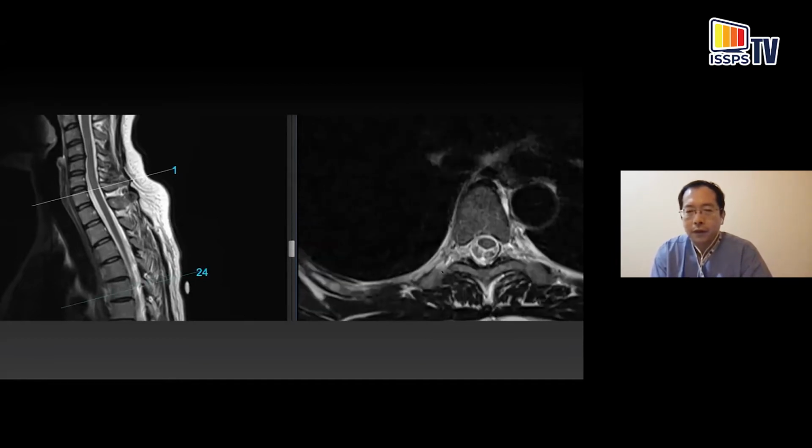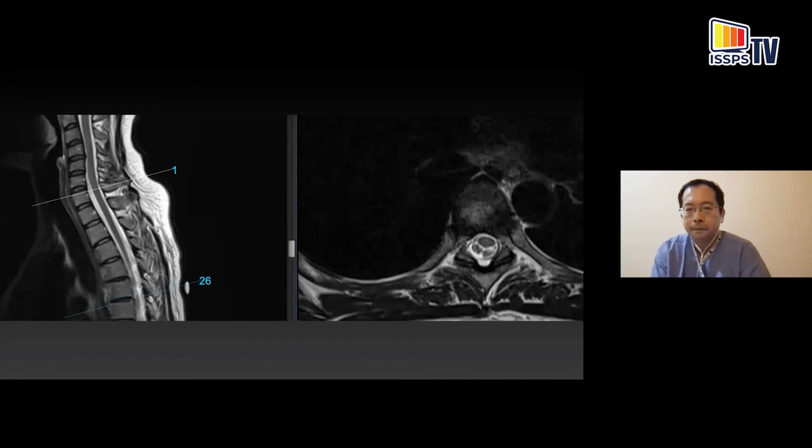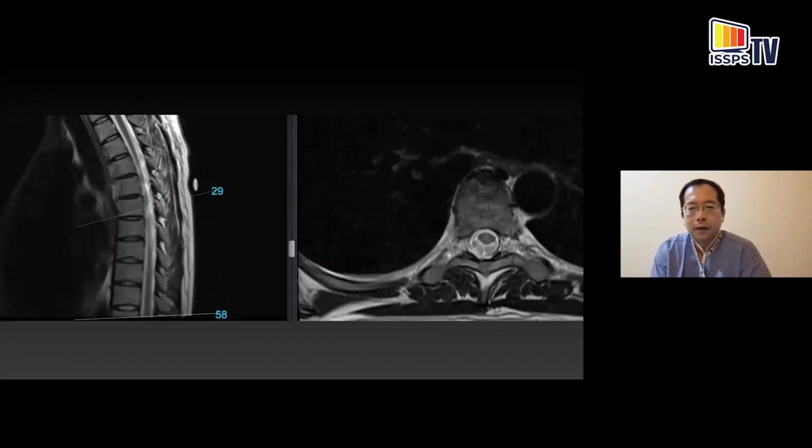Inferior to the transverse process, just here, you're starting to get into the thoracic paravertebral space again. And then one more slice below that is the upper part of the rib. And at that level, the facet joint again. Okay. And now this is going through T6.